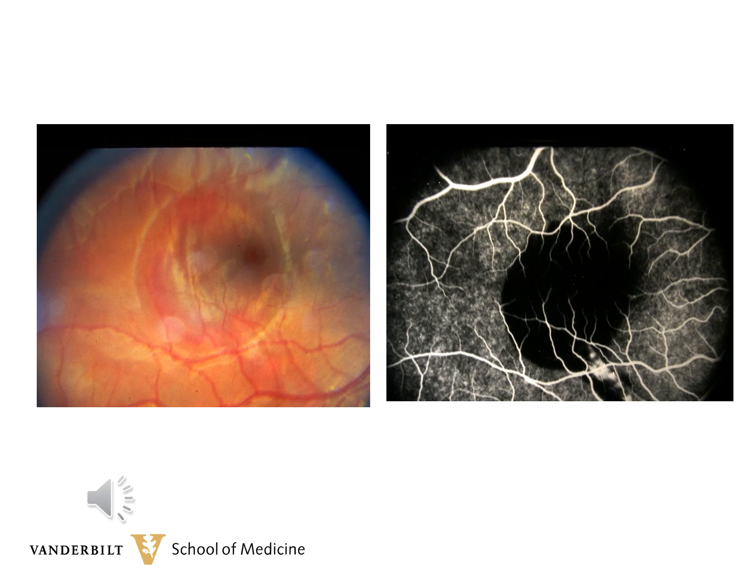This 36-year-old suffered blunt trauma to the right eye. On the color photograph, you can see subretinal blood in the central macular area, and there's also a possibility that there's some sub-RPE blood as well. This blood blocks the dye on the fluorescein angiogram. You can also see a linear area of hyperfluorescence, and this is where he had his choroidal rupture.